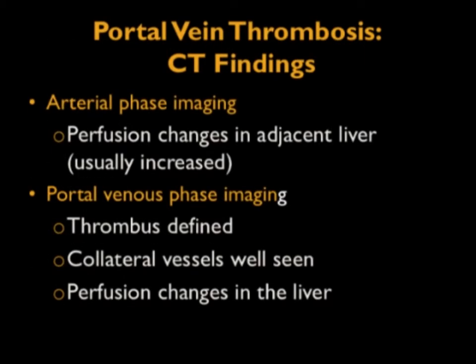If I'm looking at portal vein thrombosis, if I have arterial phase imaging, you may not see the thrombus right away, but you'll see perfusion changes. On the portal phase, you'll see the thrombus. Depending how extensive the thrombus is, you may see collaterals, you may see perfusion changes. If the portal vein is occluded, you're going to see lots of collaterals, and if it's relatively long-standing, you'll see what we describe as cavernous transformation of the portal vein.